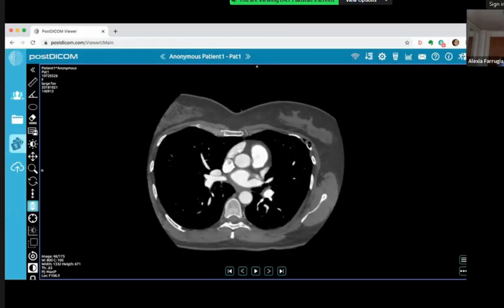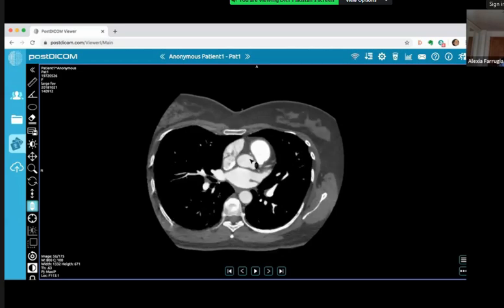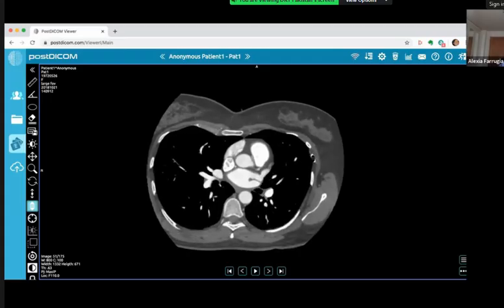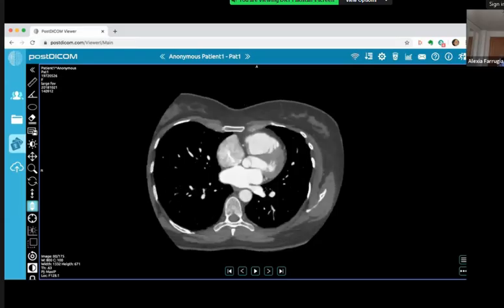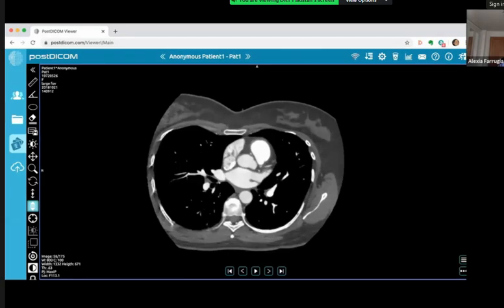So the right coronary artery is arising from the left coronary cusp or sinus of Valsalva there. And then it's coursing, as you said, between the ascending aorta and the pulmonary trunk. So that's a malignant course. And it can get easily compressed. So you can imagine there's a very small space there. And it can be easily compressed, which can lead to arrhythmias and sudden death.